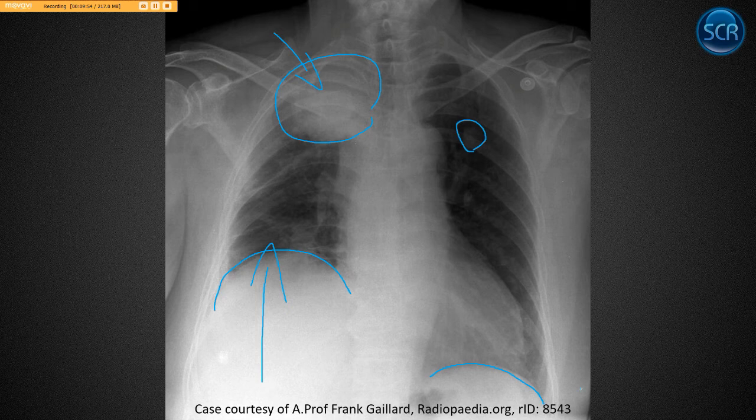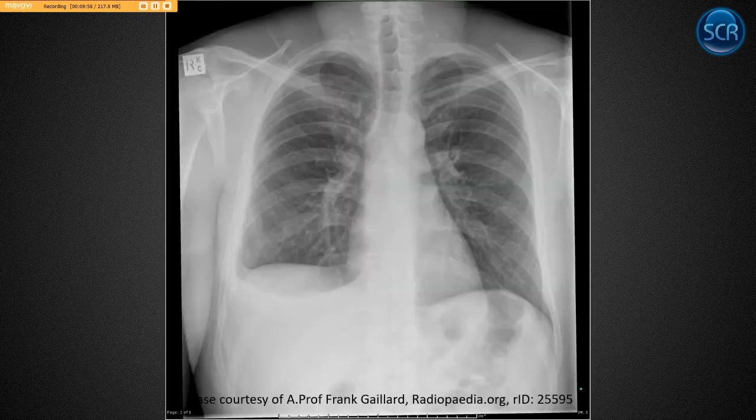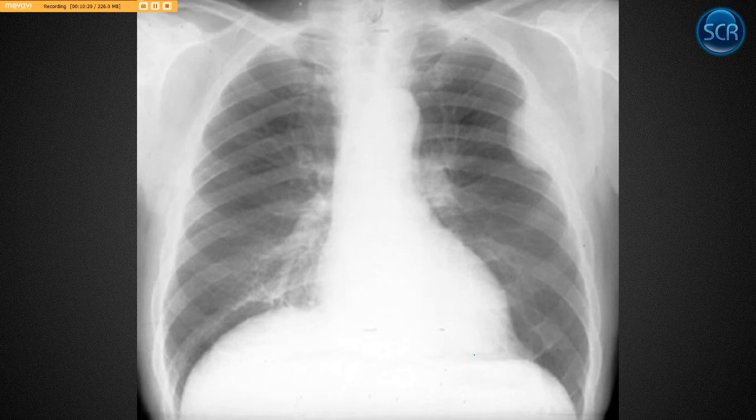This one's normal down here. Here's an example of someone with a subpulmonic effusion, right? There's a huge differential for that. It could be infection or heart failure, any number of things. But this is fluid filling up underneath the lung, right? This is our meniscus sign, okay? So this is a subpulmonic effusion or pleural effusion, fluid filling the potential space between the pleura. This is something that definitely needs follow-up chest CT and medical referral.